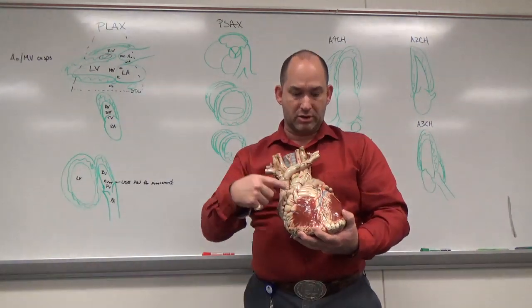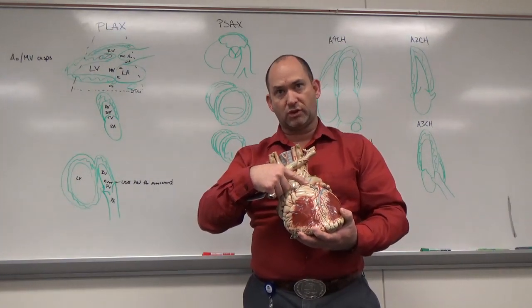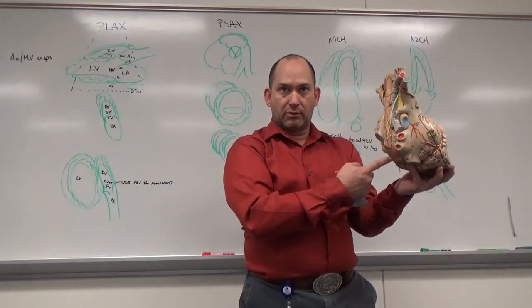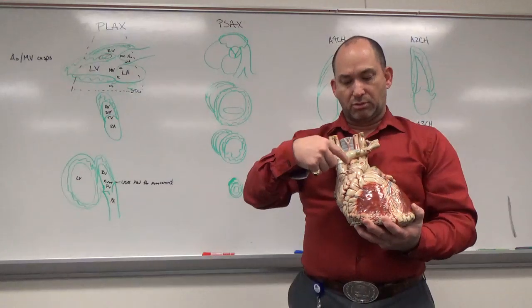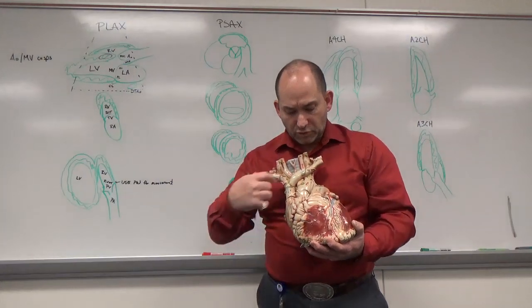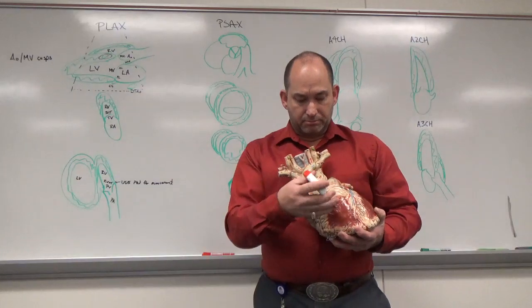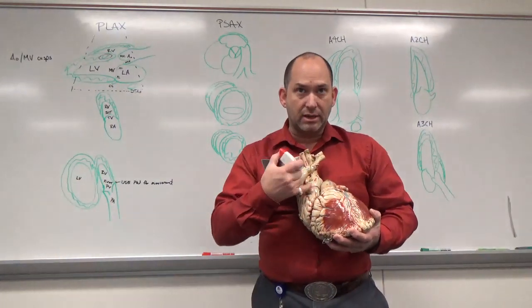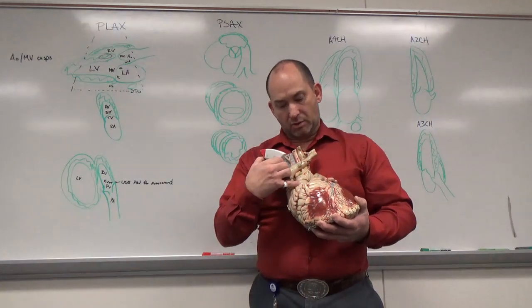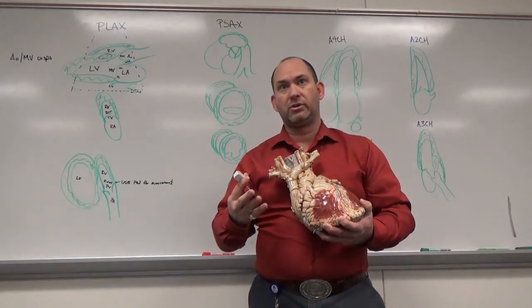This is pulmonary artery. From the valves' perspective, the pulmonary artery sits closest to the chest wall. It's the most anterior structure. The most posterior valve is the mitral valve. Okay, and then tricuspid and aorta are in between. So aorta, and then tricuspid, and then the mitral valve. So if we're looking at pulmonary artery here, here's our indicator. We want to see the aorta comes out behind that. It should have this type of a twist. You'll get into pediatrics next fall with Mark, where we'll talk about what happens when it doesn't twist correctly and we have these other anomalies going on.